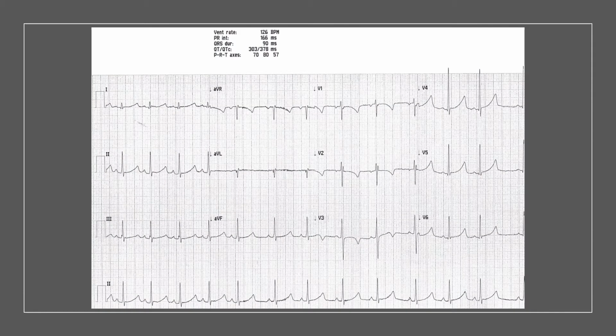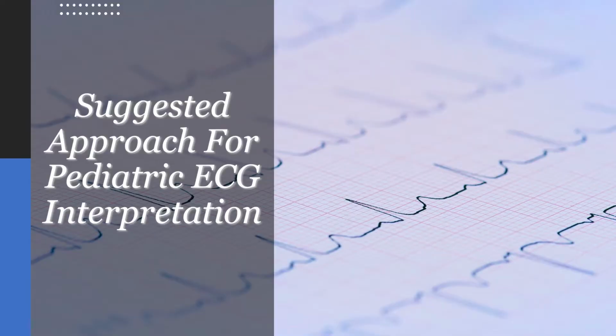What I want you to do now is click the pause button, have a proper look at this ECG, try to interpret it yourself using the approach we've talked about in the previous video, and then we're going to discuss it together. Okay, I hope you've done what we've agreed to do, and let's move on.